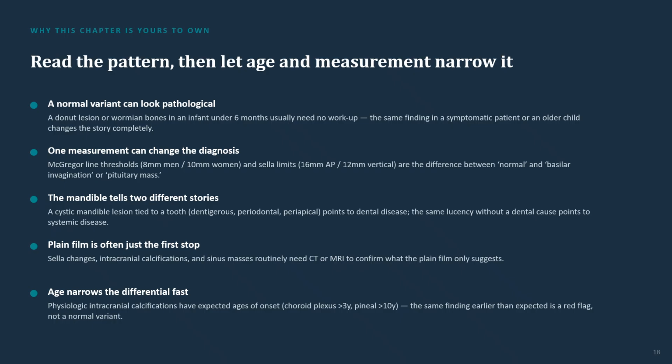In the jaw, when they're looking at these, or when you're looking at these, even though you're not making the diagnosis, we're looking at where that lesion is. Is it connected to a tooth? Because that typically is going to point more toward it being a dental cause. If it's not related to the tooth, we're typically going to consider some type of underlying disease that's affecting the rest of the patient's body.